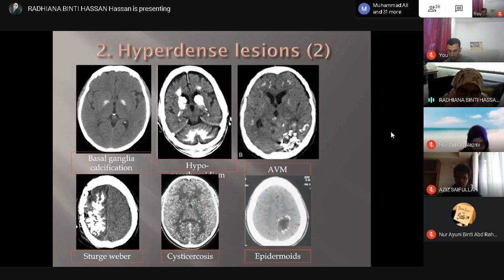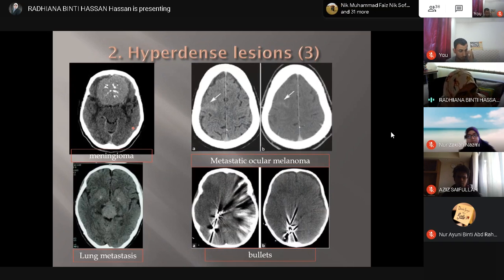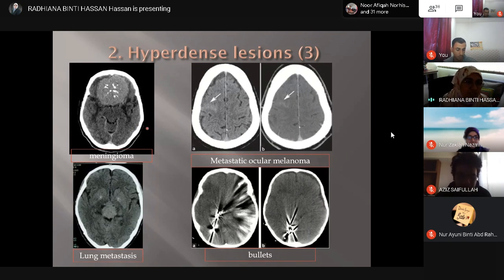Okay, so sometimes a tumor can have wall calcification like that. Okay, so for mass lesion, because I think this one is quite common for you all in exam questions, intracranial hemorrhage can all appear as a mass. Okay, so a hyperdense lesion if it is a mass is never as dense as a hemorrhage. Okay, you will see sometimes it is denser compared to brain parenchyma, and there is calcification within.